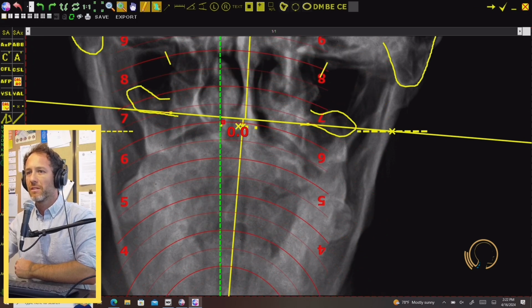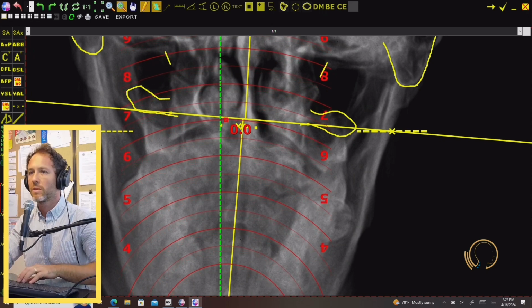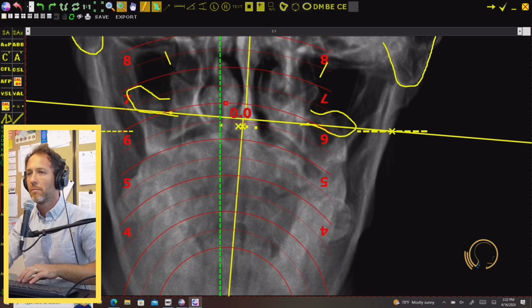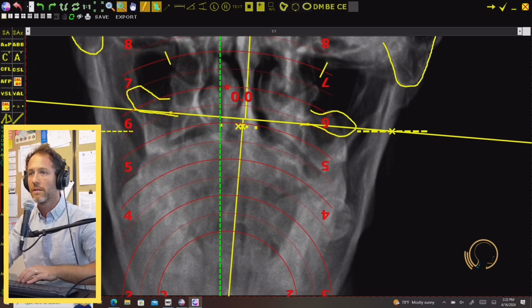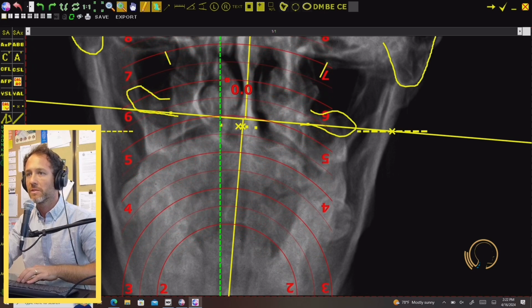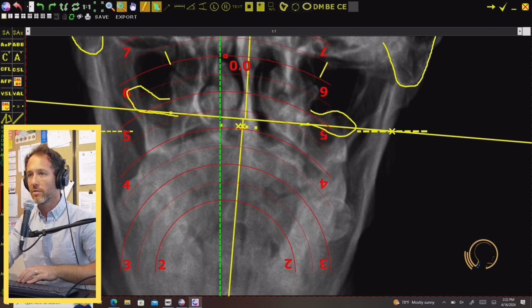I've measured hers, and hers weren't crazy different. I think she was like a half or maybe even 1 circle max different. But even me saying that, that's ridiculous, right? If you're off by half a circle or a quarter of a circle or a whole circle, that's going to impact how this person gets adjusted, and I'm going to show you what I mean. If you've never done it, throw in some different axial circle measurements.